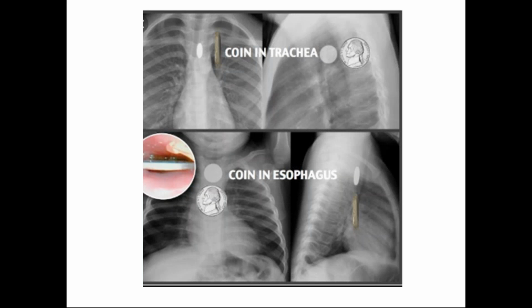Coming to the next emergency case we commonly see in the casualty, the foreign body ingestion or inhalation. The foreign body can be present either in the trachea or the esophagus, and if we know what the foreign body is, we can identify it based on the radiographs, that is, the AP (anterior posterior) and the lateral radiograph. For example, let's take a patient who has ingested a coin. We want to know whether it is within the trachea or the esophagus.